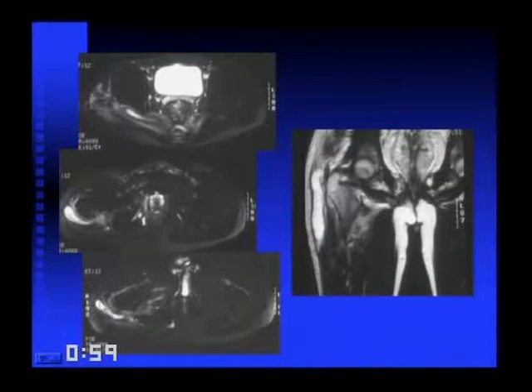This thing was kind of flipping over the iliac crest and involving both sides of that hip. Here you can see the network originating here laterally around the femur, and here you can see on the coronal just how long and extensive this hip abscess was, all from Crohn's disease. So that is an overview of pelvic imaging.